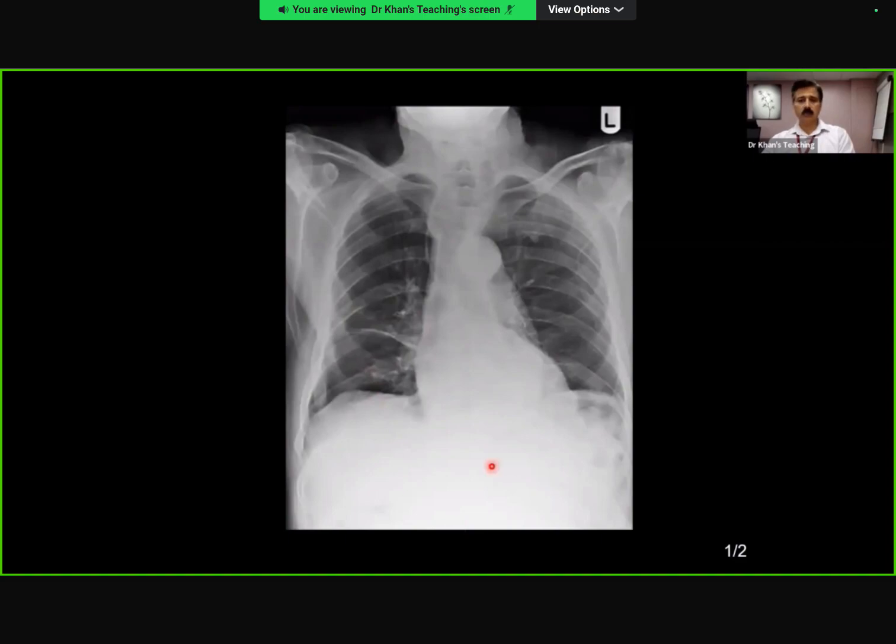So this is the frontal chest X-ray of a skeletally mature patient. What I can see is there seems to be an elongated soft tissue mass starting from the right superior mediastinum along the right paracardiac border. It also appears to be involving the left side of the mediastinum and along the heart border. So this seems to be a dilated viscus in the mediastinum. My prime differential would be that this is a dilated esophagus, probably achalasia.